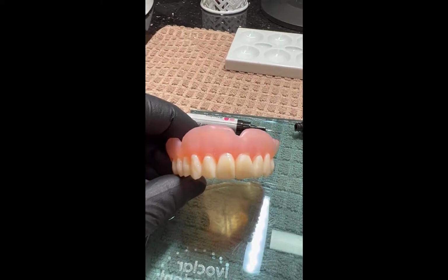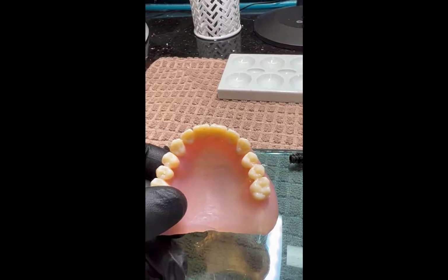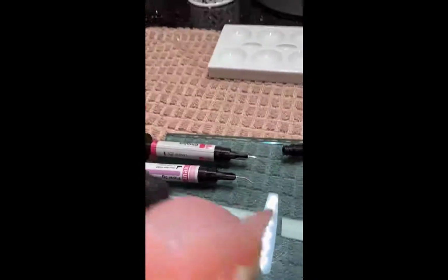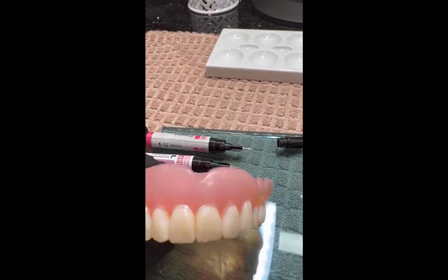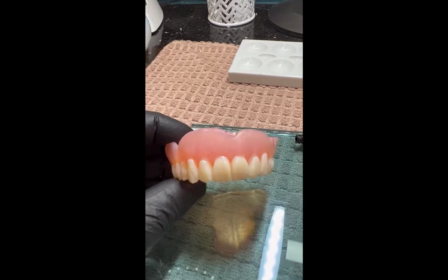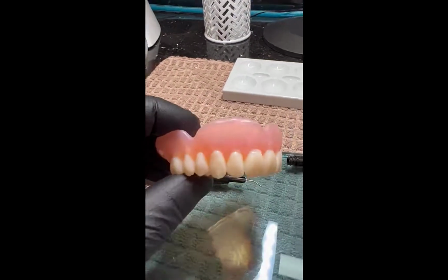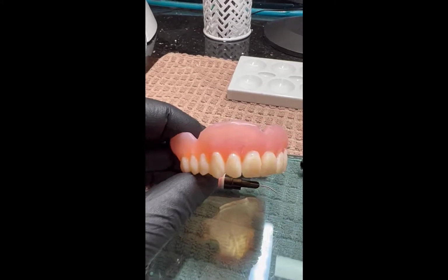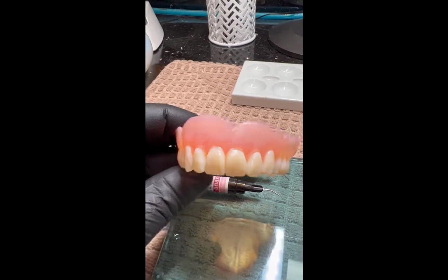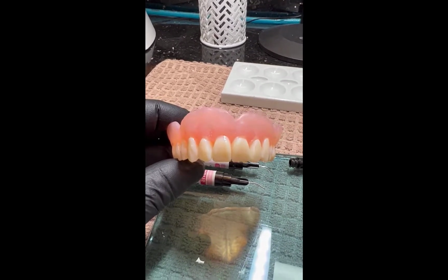Okay, so this is after bonding. We've already got a pretty nice result here, but I'm going to try and spruce it up. I'm going to use some Annex Gum Flow and just add some pink in between the teeth and some red just to spice it up a little bit. I don't want to spend too much time on this because, as it gets more labor intensive, it begs the question of why not go by hand. So I want to do things that are cost effective and time efficient for you, and I think this is going to add a nice little touch to it. So let's see how that goes.